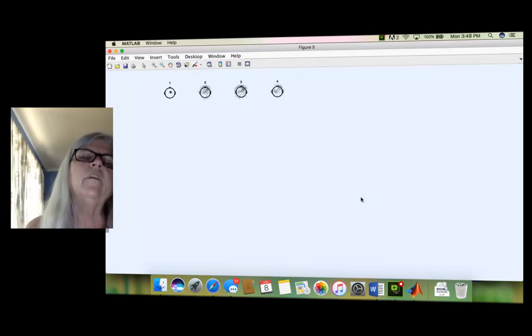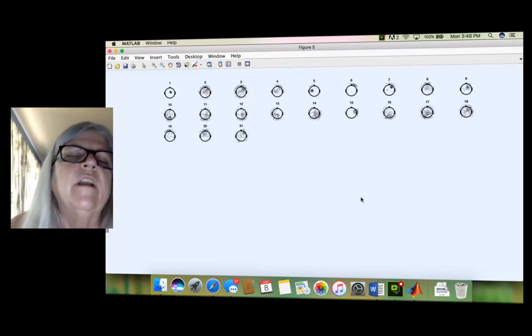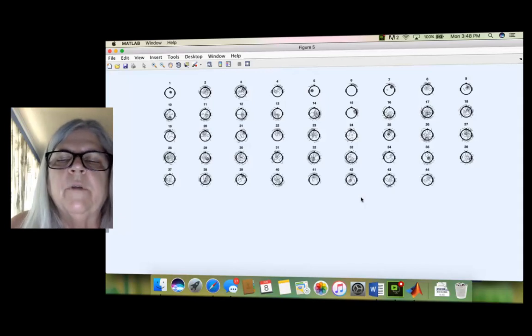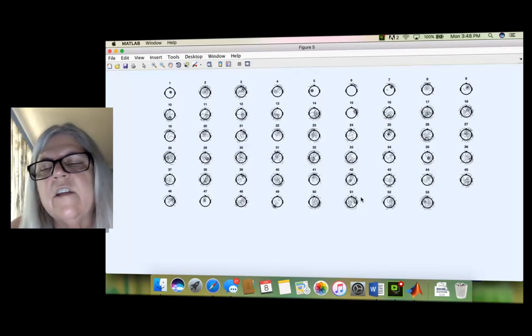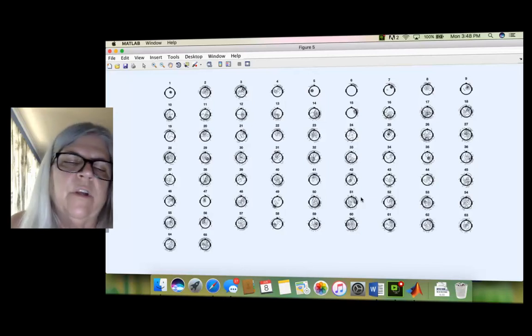All right, now what it's going to do is pull up a two-dimensional map of the head, and it's going to show me for that individual component where its energy is concentrated over the entire time frame of the data set. So I'm going to wait until this loads. It's kind of slow, and this is actually legitimately a slow process, but it certainly is slowed more by the fact that I am recording.